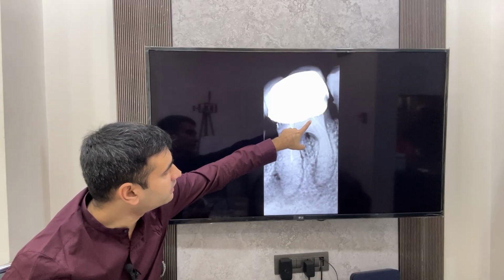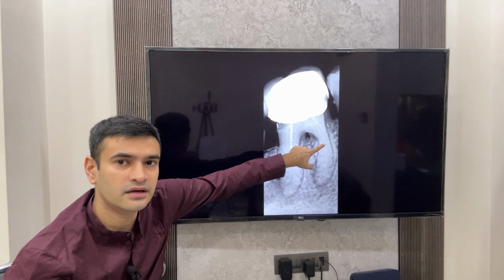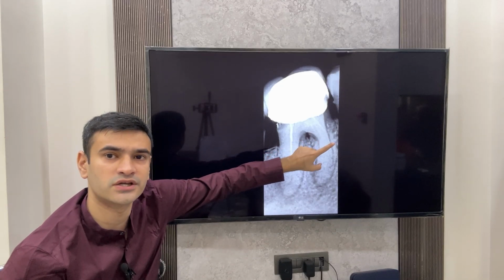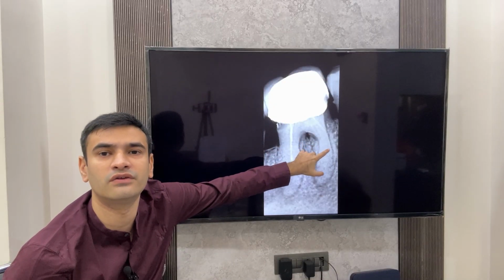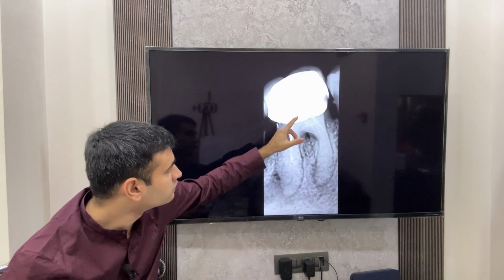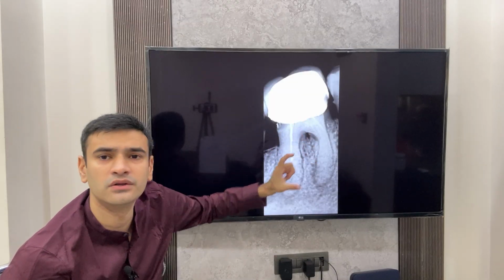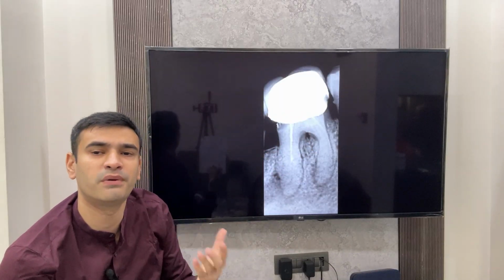Because the dentist tried to go till full working length, but could negotiate only till here. And maybe by continuously trying to achieve patency, he made some errors here, for example ledges, or he might have blocked the canal completely. So you can look into the X-ray for how much the previous dentist has accomplished inside the canal.